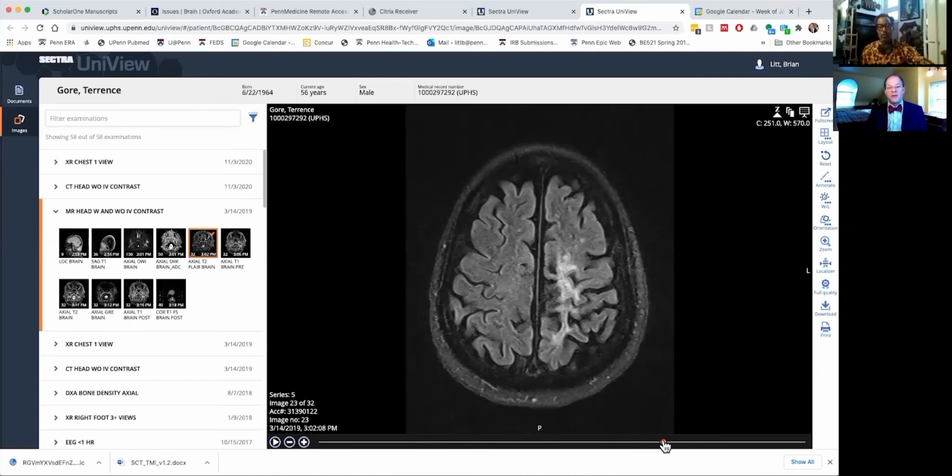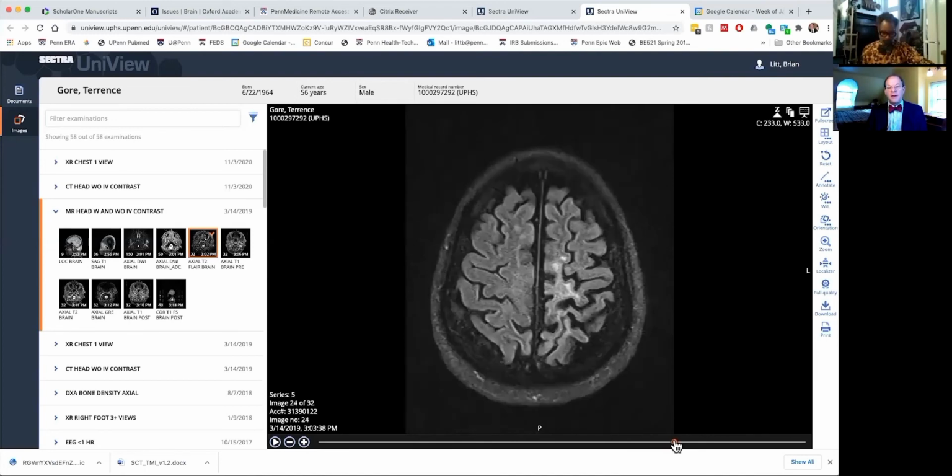and to the rest of your body. And so if we go further up, because of the damage to the white matter, you see that there's atrophy in this area of the cortex. See how normal and plump these gyri and sulci are here, but they're really thin and atrophic over here. And that's because they're not being exercised because they're not hitting their target and communicating back and forth with the limbs.